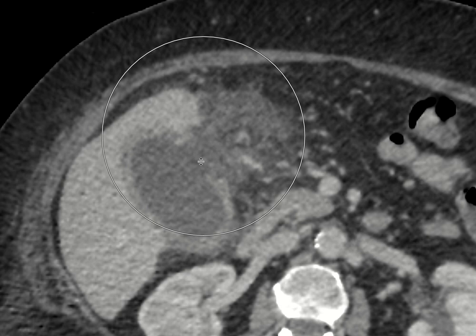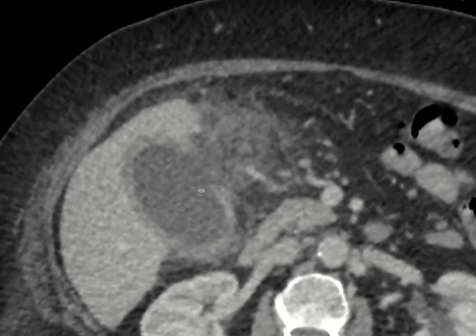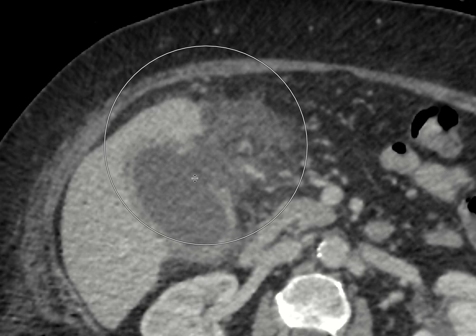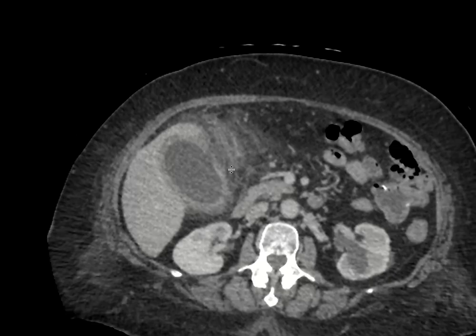And one of the effects of gangrenous cholecystitis is that you could actually get disruption of the gallbladder wall from ischemia, and then it ruptures, and then you get a perforated acute cholecystitis. And so that's what's going on in this case. The contents of the gallbladder are now spilling out into the peritoneum.